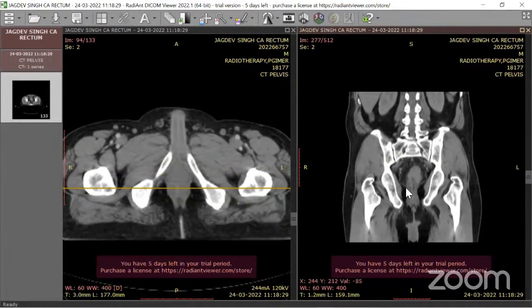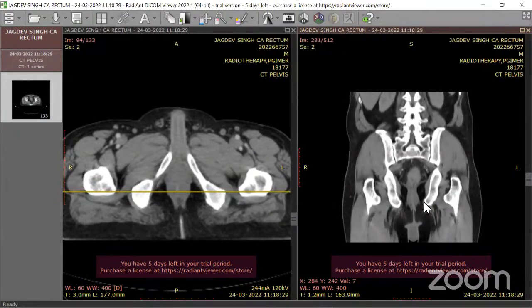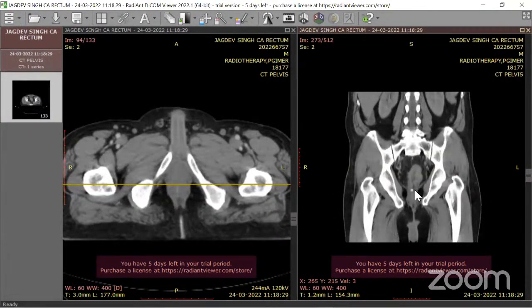And this is the insertion of the levator ani muscle, and this forms the sphincter. So generally this, and you can see that we have kept the marker here at the distal border of the growth, which is exactly corresponding to the level of insertion of the levator ani. So in this case, the lower boundary of this mesorectal volume will go at least 2 centimeters below it.